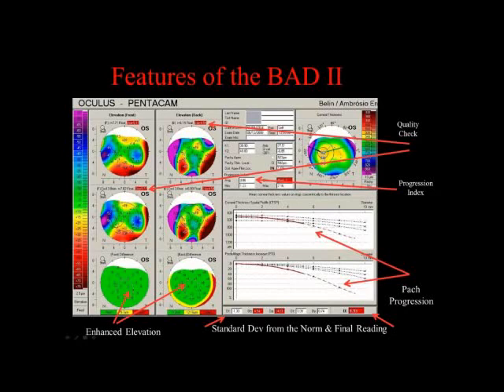Why is that? Even though you don't have 8 millimeters of coverage here, and you don't have 8 millimeters of coverage here, so this is not valid and this is not valid, corneal thickness can only be generated if you have both anterior and posterior data. If you look at this graph, when the line is solid, that's telling you you have anterior and posterior data all throughout up to this point. Then it becomes dotted. But from this point back, this is valid information, and you can immediately see, even from this area back to the center, it's highly abnormal. So yes, I would try to re-image this person, but I immediately know that this is not a normal eye and is excluded almost immediately based on this pachymetric progression, even though it only goes out to this point.